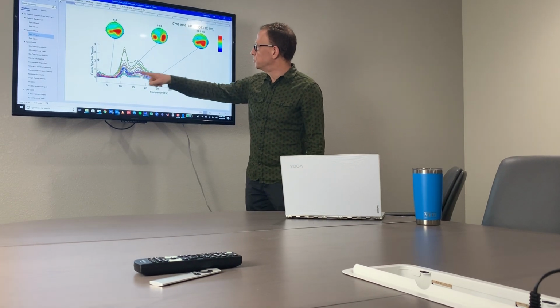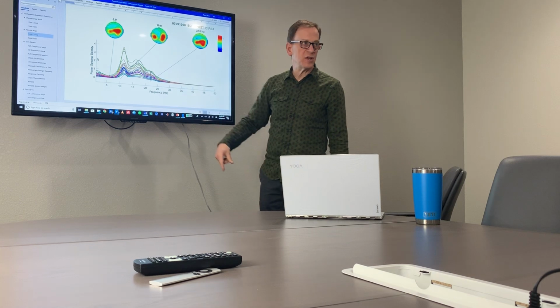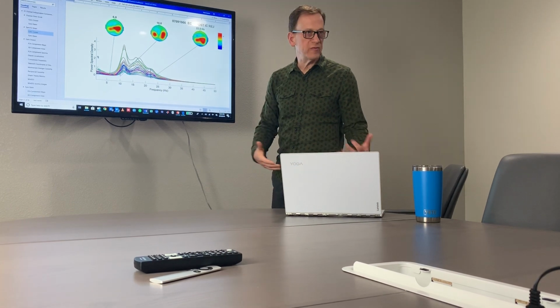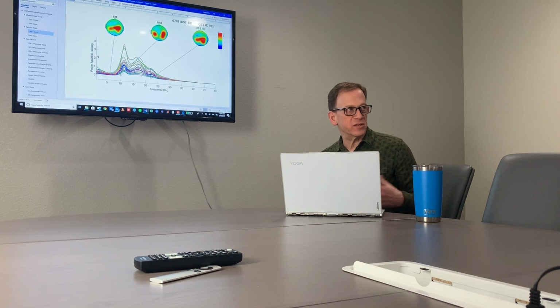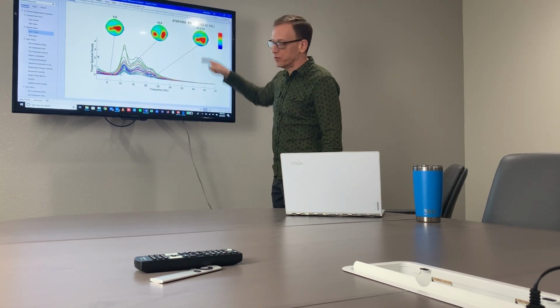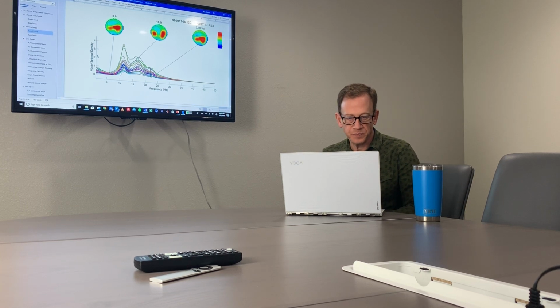So at 10 hertz, you see sort of red areas over the right and left side in actually what's called a mu rhythm pattern, which is a distorted form of alpha that affects how you think, how you relate to other people, how you modulate emotions, things like that. And then we can see an excess of beta activity more over the right side, which frequently, again, has a lot to do with anxiety.